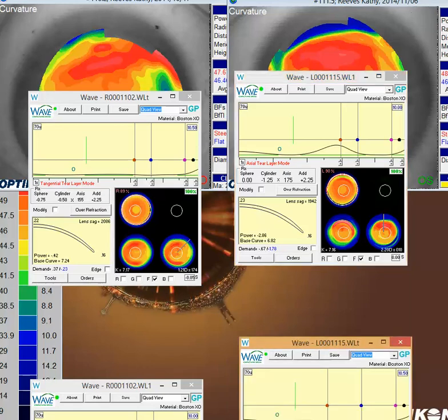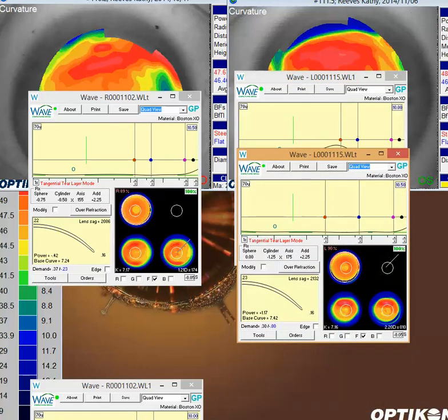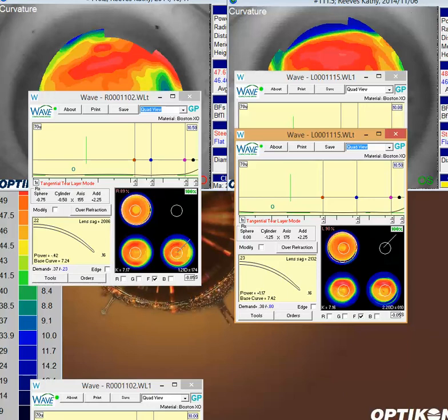And once again, I mocked up a little sample lens here. I went to a little larger diameter. I moved the red dot a little bit more towards the center, a little closer in there. I set around 5. There's not a specific area that you need to, but I try to set it there. I went to a little back surface asphericity, the optical zone, switched to tangential and redesigned it.